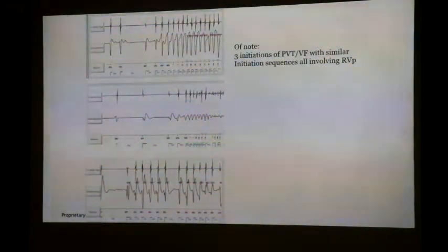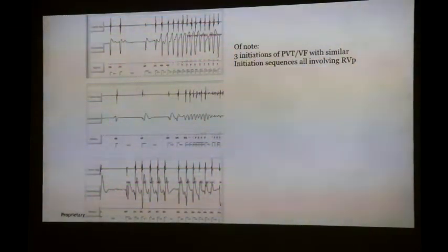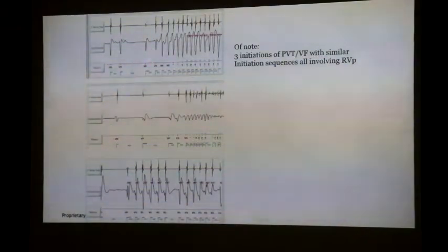Was he treated? Was he shocked? I'll show you in a minute. Well, step one is picking up that we are probably pro-arrhythmically pacing. So we might need to turn pacing off, although he's got AV block, so we might want to see how AV blocky his AV block is. In these situations, when you're seeing this, it's complicated by AV block. Sometimes we think, let's lower the pacing rate, but that usually doesn't work. You sometimes just have to turn pacing off.